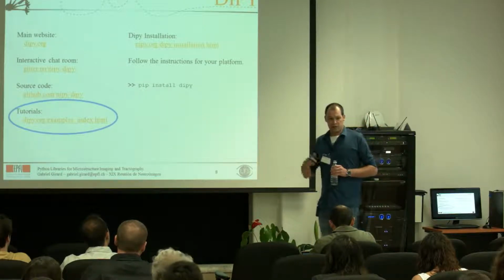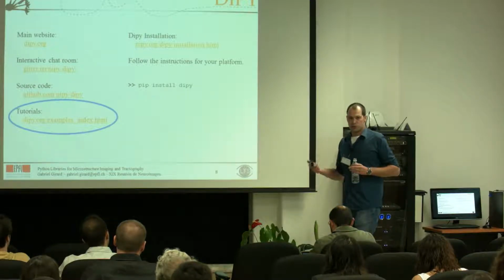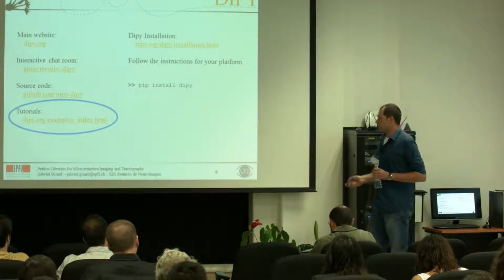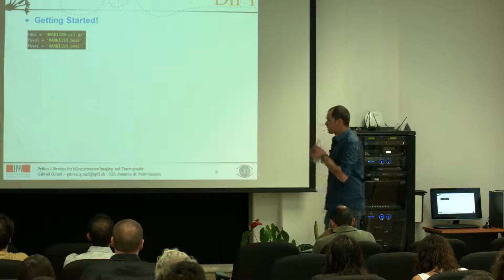But on the other hand, you control every parameter and you know exactly what you are doing, and it's then easy to extend and build upon the current code that is there. So just to get started, we need some images.